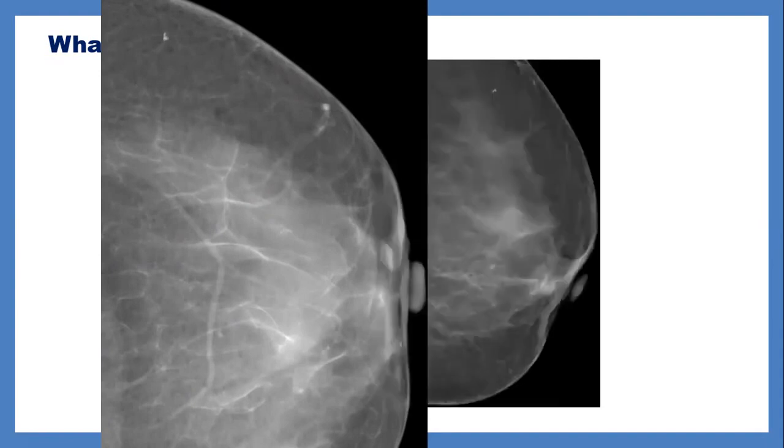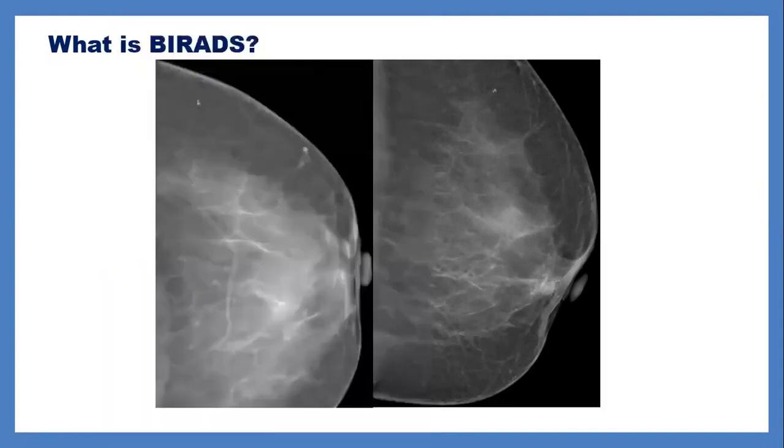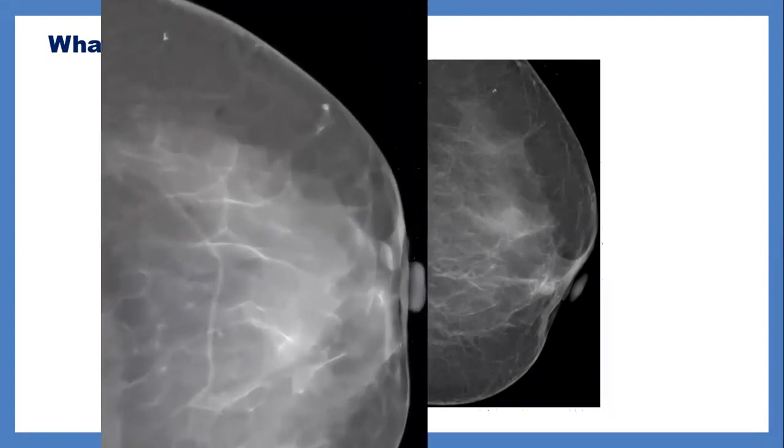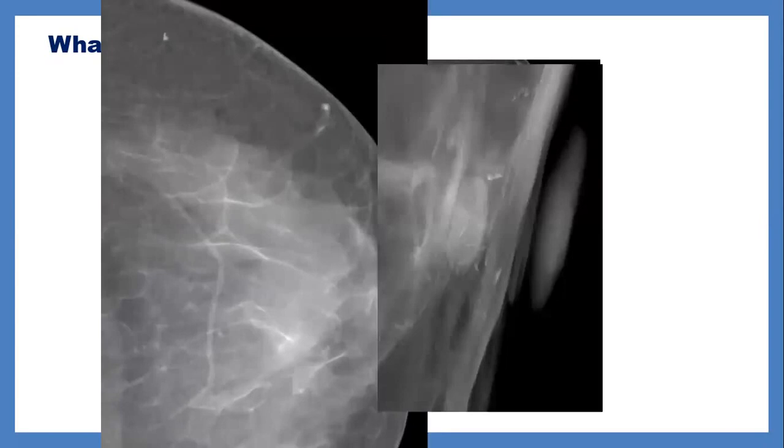So look at this mass or these lesions. How does it look? The direction.